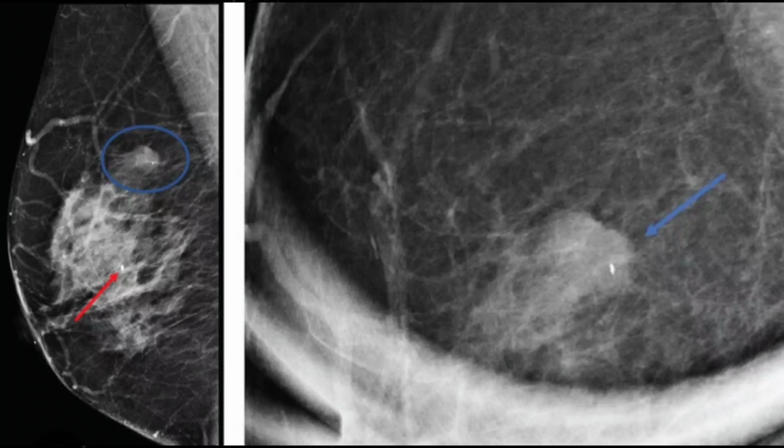Because of the magnification view, you put all these calcifications in view to identify which type of calcifications these are, and the histological characteristics of these microcalcifications. So therefore you need this supplementary view, called the magnification view, and it will look like what you are seeing in this imaging.